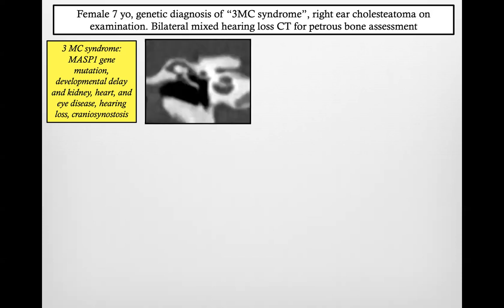We didn't know before this case report that we published what was the cause for hearing loss, but you can see how this is a small tympanic cavity with some soft tissue opacification. Now, they thought there was a cholesteatoma, but are we really sure? First of all, look at the scutum here. The scutum should be sharp and triangular. Here it is truncated. And also the profile of the bones looks a bit eroded.